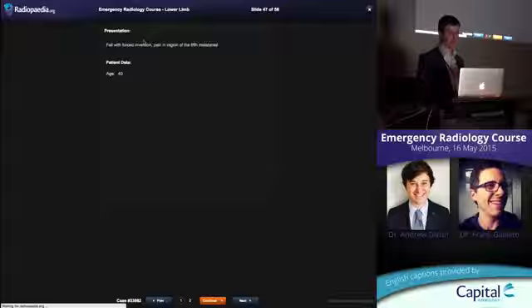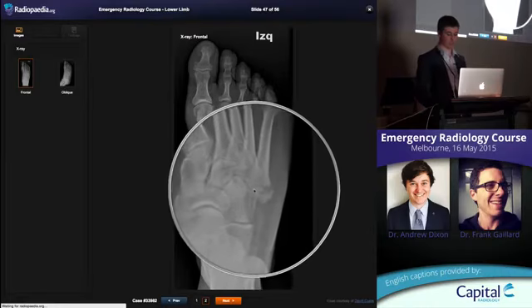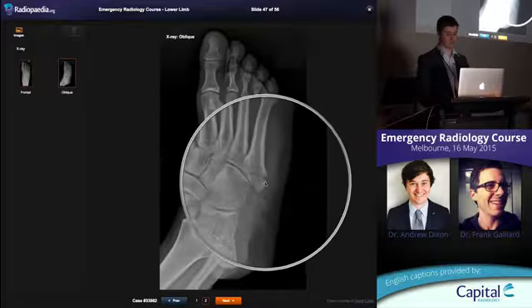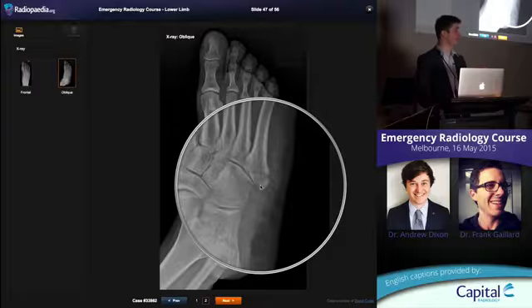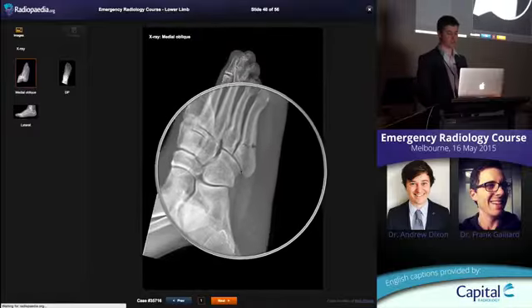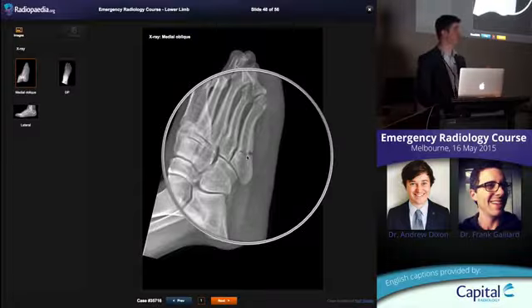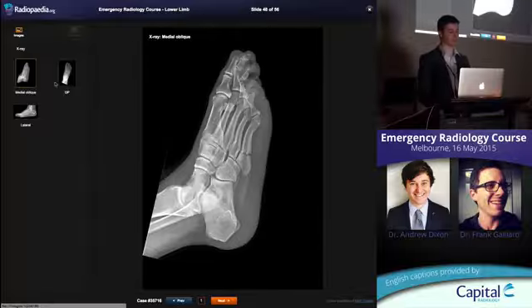So here we go, forced inversion injury, fifth metatarsal pain. Here's the picture, transverse fracture coming into the joint here on the oblique radiograph, slightly displaced. That's consistent with a peroneus brevis avulsion injury, the base of the fifth metatarsal. This one further along doesn't go into the joint, joints all preserved, so not an intra-articular fracture. Further along, this is a Jones fracture. There's no suggestion that there's underlying stress response in the bone, so it's not a stress fracture.